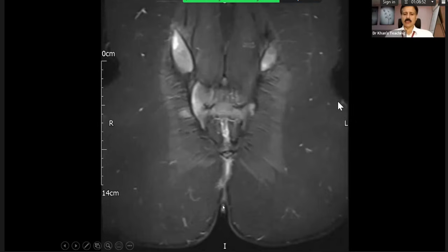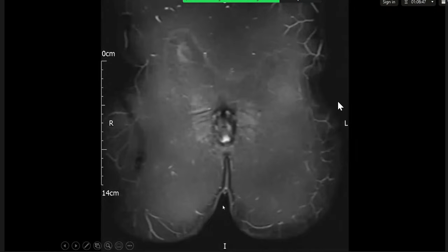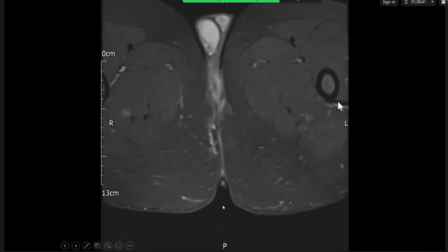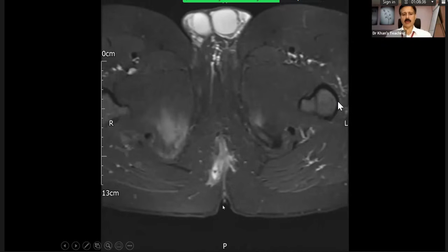There are more sequences also. More sequences, okay, I'll carry on. Yeah, there is an axial, and you might be able to orient it more. You know, this is, consider it a long case for you, right? Sure, okay. And the marks will be according to your findings.